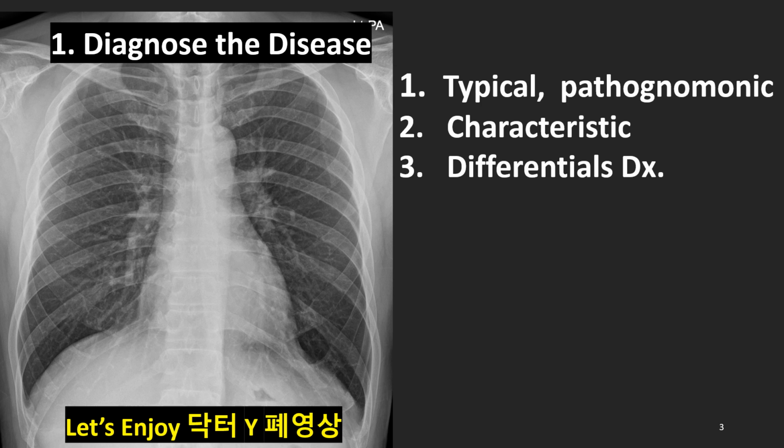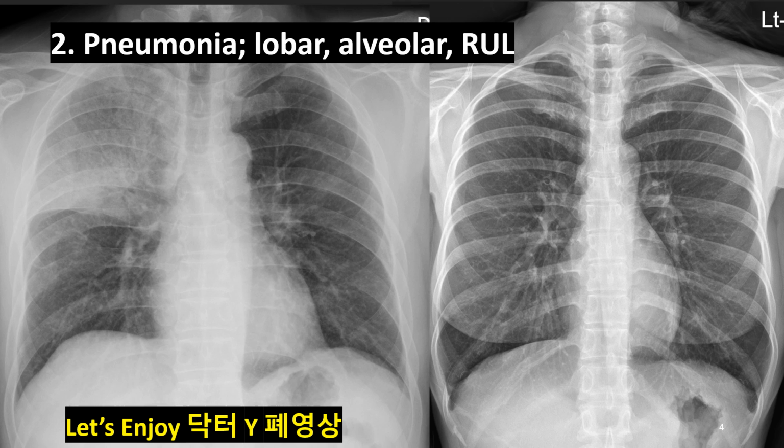So the basic role of the radiologist is differential diagnosis. Narrower the better, not the pinpoint diagnosis, but narrowing the differential diagnosis. From now on in this session, I'll show you 9 pathology conditions with relatively characteristic, relatively typical findings.